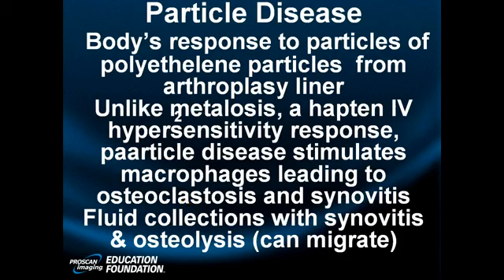Particle disease. This is the body's response to particles of polyethylene from the arthroplasty liner. Unlike metallosis, it is a hypersensitivity response. It is a macrophage-induced disease that leads to osteoclastosis and basically mixed synovial reactions. So you see synovial hypertrophy. The osteolysis comes later. This patient doesn't have it yet, but they will. So this is a prelude to loosening.